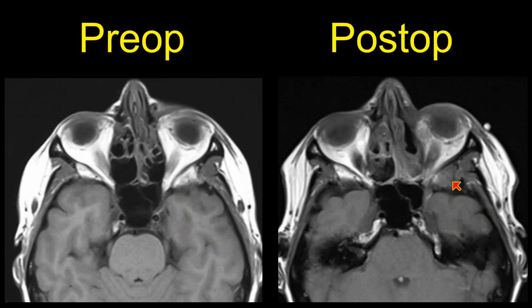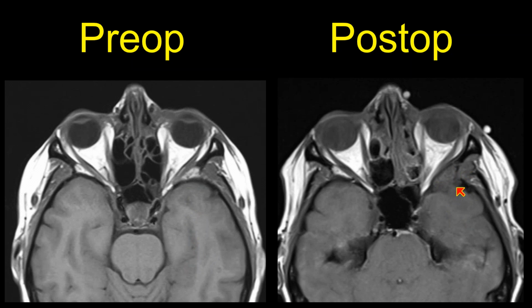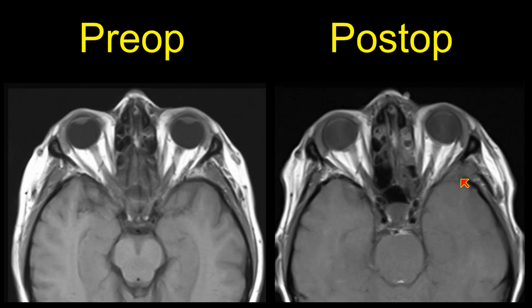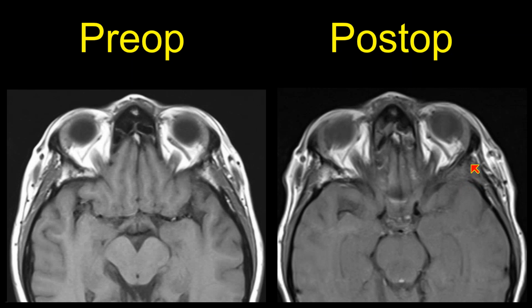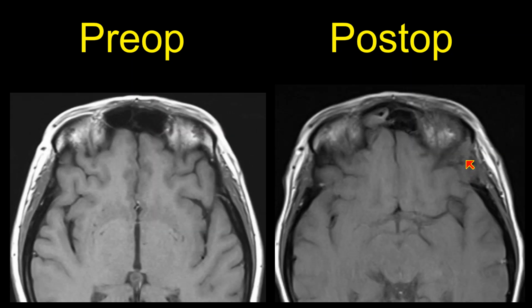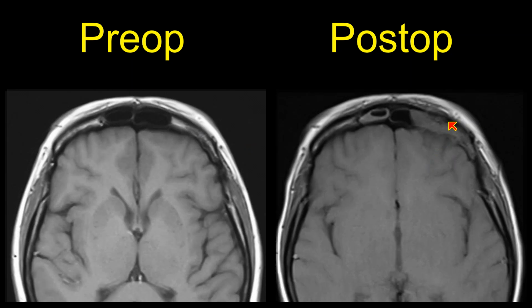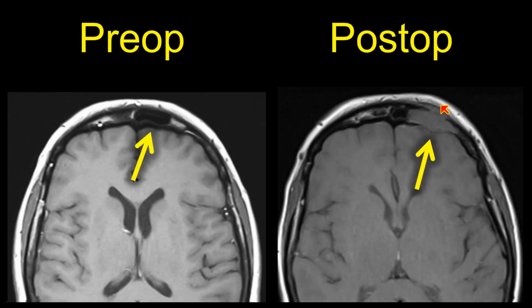This patient actually had tumor crawling up through the marrow of the lateral wall of the orbit and going up to the skull base, and that extended superiorly through the lateral wall of the orbit, the greater wing of the sphenoid, and then extended up cranially to involve the frontal sinus, where we previously had normal bright fat, and at that point it went both intracranial as well as in the subcutaneous tissues. So remember, there's a lot of different ways for tumor to spread. Perineural tumor spread is just one of those ways.